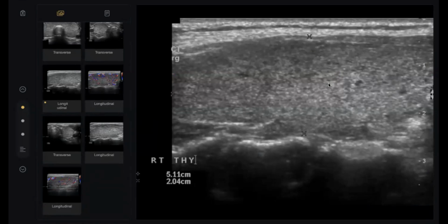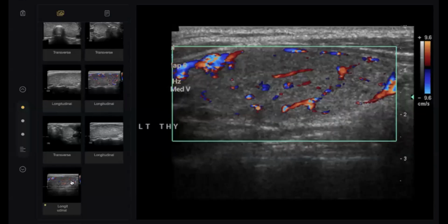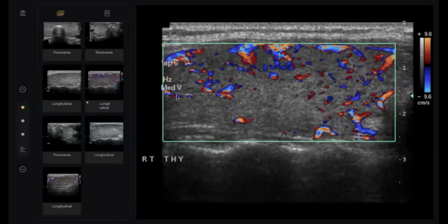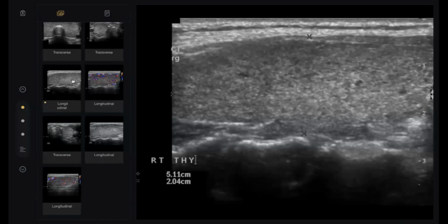I agree with you that in very early stage of thyroiditis it may be homogeneous, but commonly Hashimoto must have some heterogeneity. But this is homogeneous. What else? There are no nodules. I think then it would be reactive. What other diseases make the thyroid hypervascular, enlarged, homogeneous?